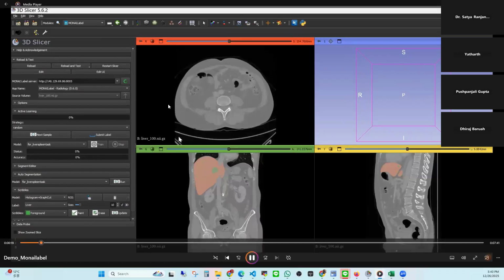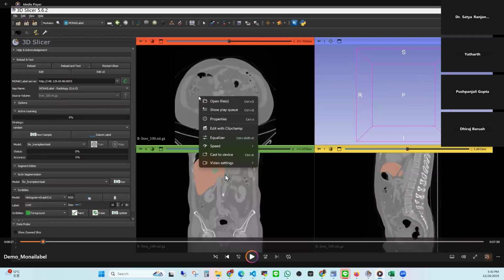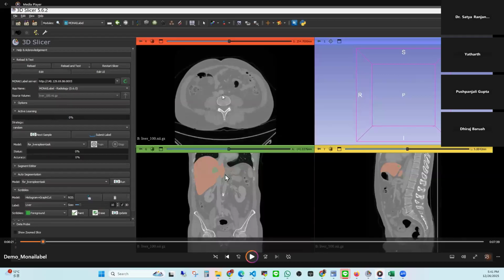Okay, somebody has just asked in the chat which image we are going to use. For this, we are going to use the two open datasets I have used in my work: the MSD, Medical Segmentation Decathlon dataset, and also the TCIA dataset. But the first one is better to use because you can see the tumor easily. This image is from the Medical Segmentation Decathlon, from Task 3, which is for the liver. So you can see this is the image.